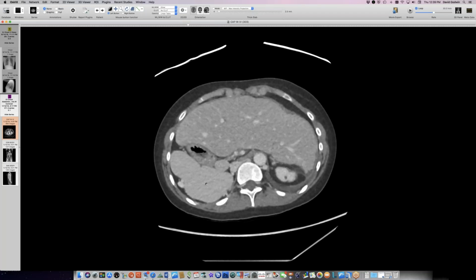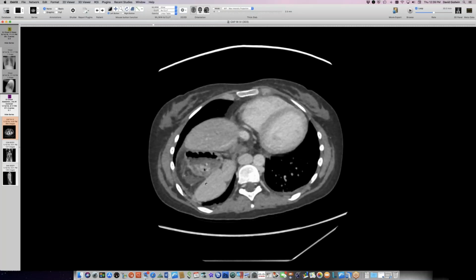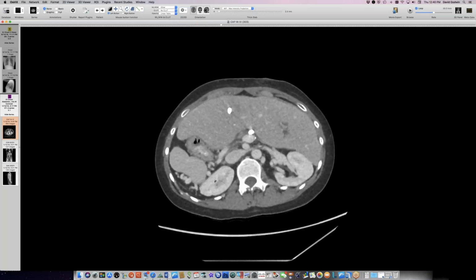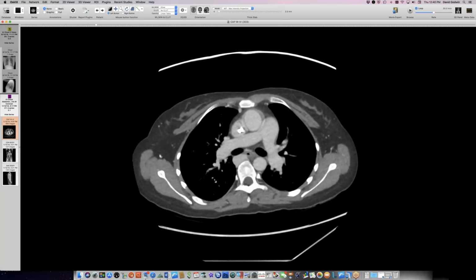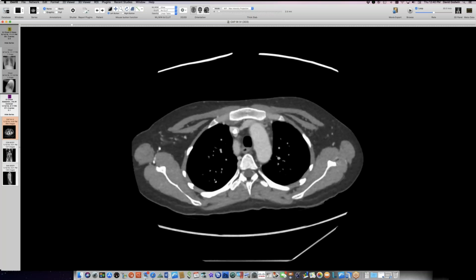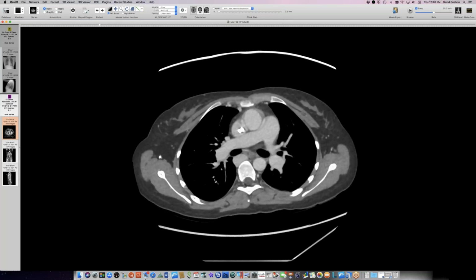Now, is this spleen over here? It looks like spleen there. So it might be a linear type spleen. Okay, so the spleen's not in the place it should be, and I don't know about the gut, whether the gut is malrotated here too. Okay, so I guess it's not asplenia if the spleen's over there, but this person has too much right-sidedness, I think. With the airways, I was going to ask.